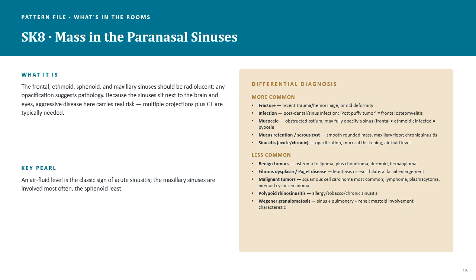So the main thing to remember when we're looking at the sinuses, a normal sinus looks very dark, and again, that's because it's filled with air. So if we start seeing the sinus looking white, bright, or cloudy, the doctor has to determine what is actually filling the space.